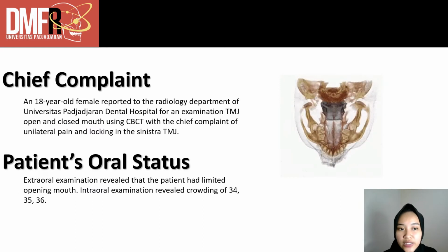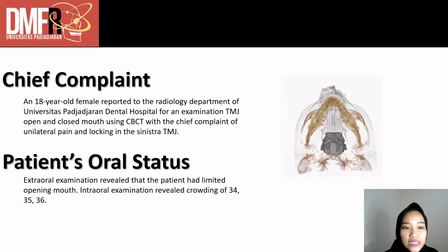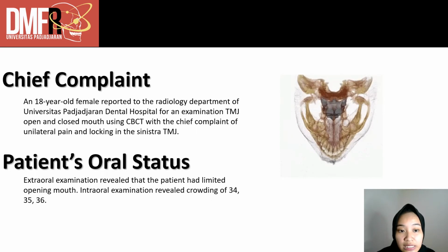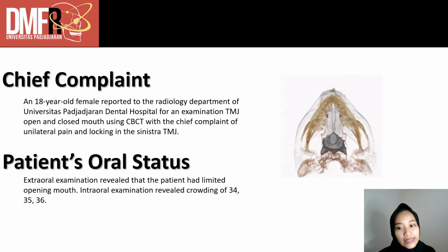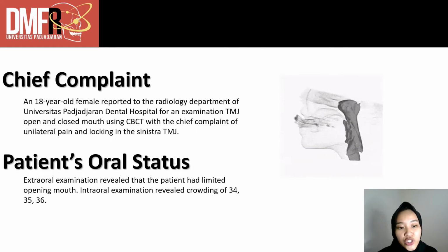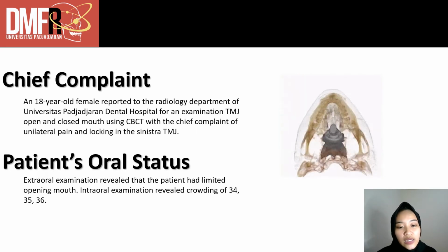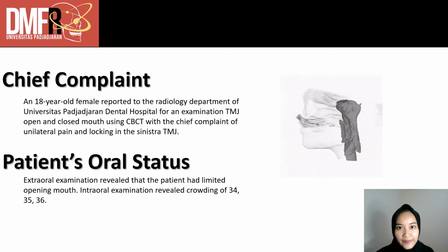So, an 18-year-old female reported to the radiology department of Universitas Padjadjaran Dental Hospital for a TMJ open and closed mouth examination using CBCT, with the chief complaint of unilateral pain and locking in the sinistra TMJ. Extraoral examination revealed that the patient had limited mouth opening. Intraoral examination revealed crowding of 34, 35, and 36.